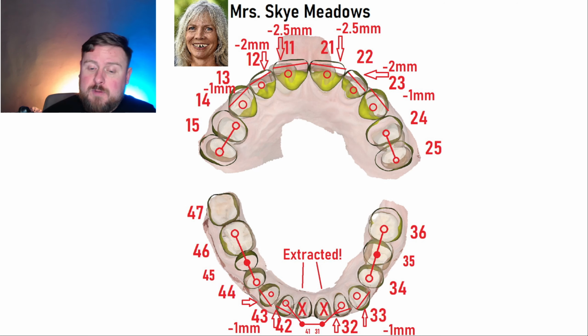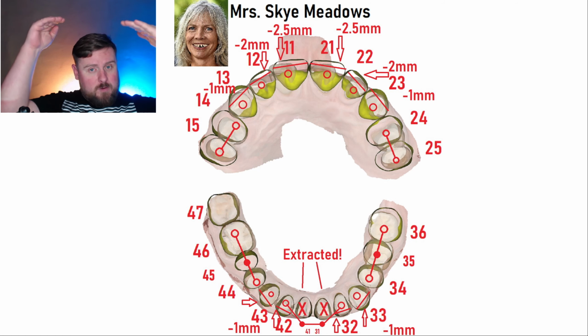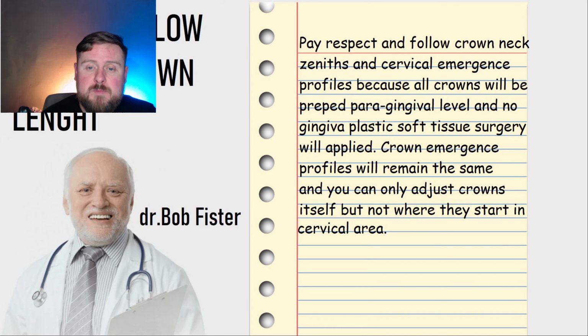The same goes for the lower jaw. From the buccal side, he also can remove around, as written here, around 1 millimeter from the buccal side and from the top, from the incisal edge, so you could make nicer anatomies.